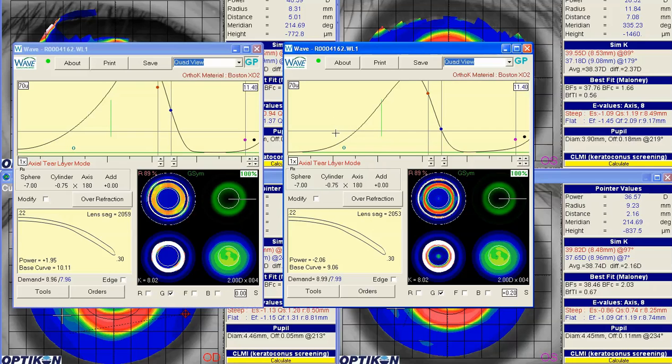It doesn't cross the 20 micron line as close as it does in the original lens. So hopefully this will give us a little bit more space for the treatment zone to enclose the pupil while retaining the same refractive post-wear refraction that we've got from before. So that's another way that we can increase treatment zone size for patients who are suffering from glare and halos.